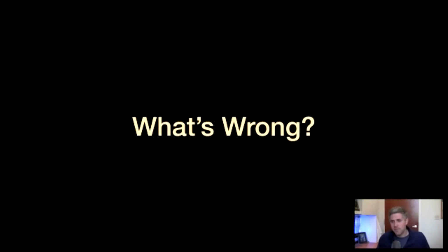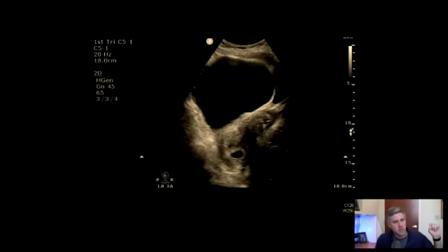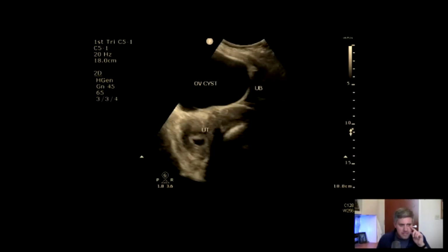However, I'm bringing it up in the pitfalls section. So the question is, what's wrong with this study, right? And so we're going to go back. Let me show this image, right? So this is one of the images that was captured in the study. And as we look at this, that's a very large fluid collection, right? But is that the bladder, or is it something else, right? And if I put some labels on that, we can see that maybe it's something else. This is actually a very, very large ovarian cyst.